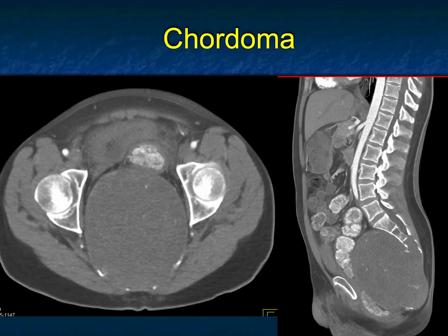So the diagnosis, please, I think you should have said chordoma first. You could go through Mets, drop metastasis, rectal cancer. All those things should go through your mind, but they should be dismissed based on the appearance of this lesion. A very nice example of chordoma.